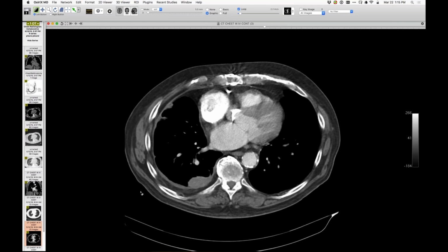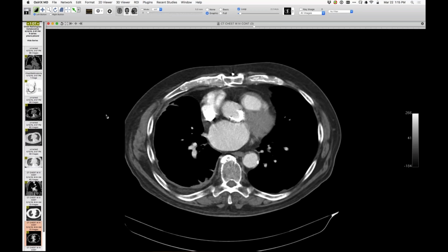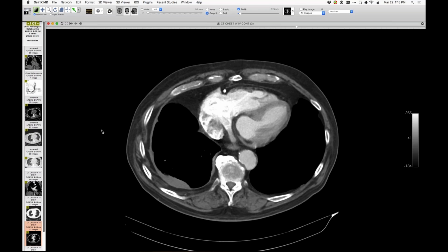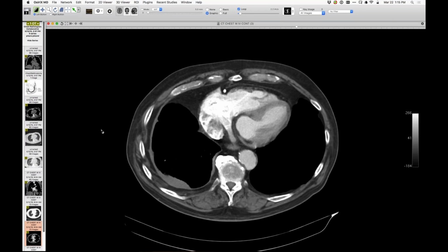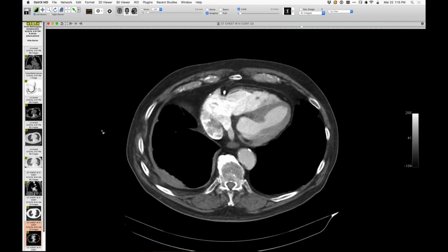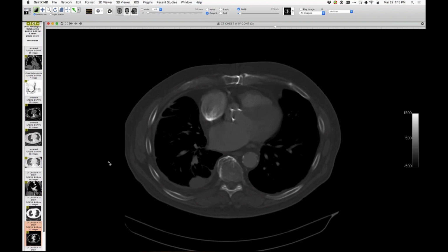There are foci of rounded atelectasis. I don't know why there's so much pleural thickening in the one hemithorax, but again, I'm showing it primarily as a really nice example of that hyperplasia or hypertrophy of fat. And Howard, going along with that, subcostal fat. Looks like there's a little hyperostosis of the inner margins of some of the ribs. Let's have a look. Not the best example, but there's some. I think there's a little thickening more on one side than the other side.